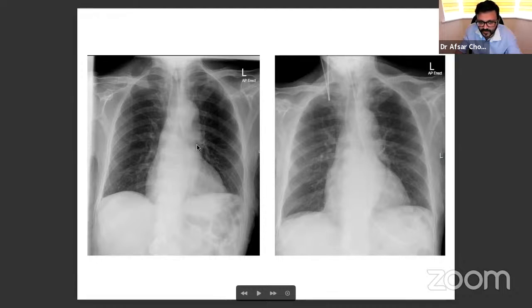So if it is going down here and then it dips down or goes straight, then it has to be in the lung. If it is crossing the air column of the bronchi, then it has to be in the esophagus. So in this case it is crossing medially the air column, so you can push it directly. You don't have to withdraw.